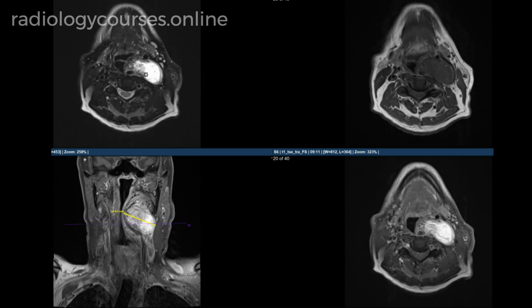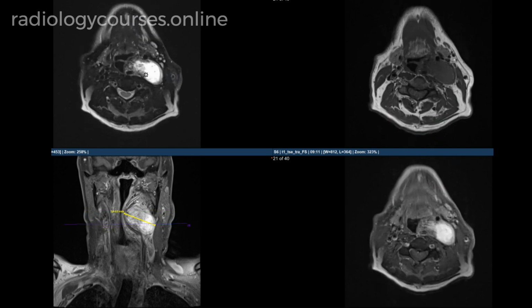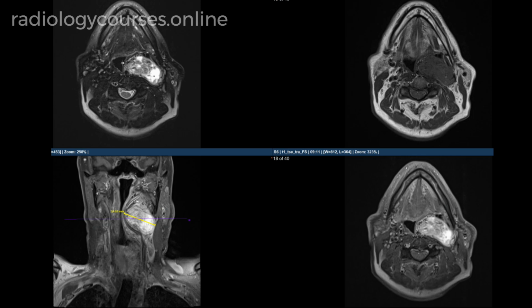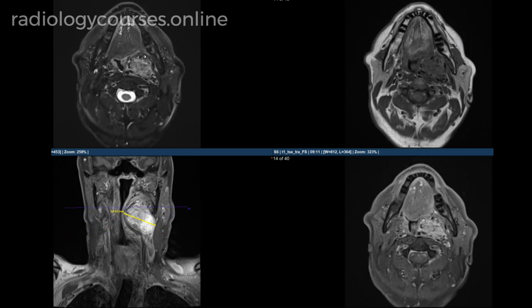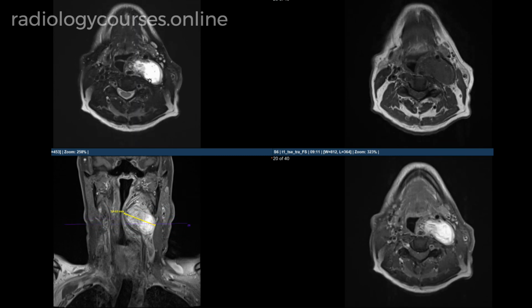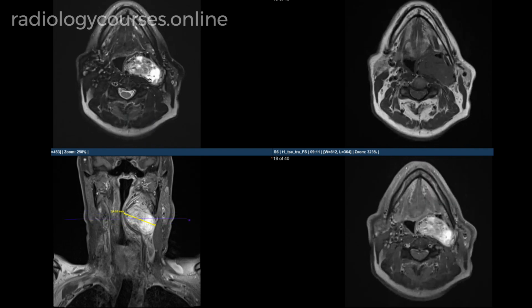Hence, the tumor is in the carotid space or posterior parapharyngeal space, as some people tell, but I would prefer the term carotid space, which differentiates it from a parapharyngeal space. Once we localize the tumor in the correct neck space, then half of our problem is solved, because the list of differential diagnoses will be significantly reduced. After that, we characterize the lesion.